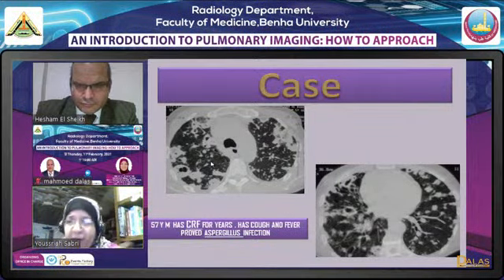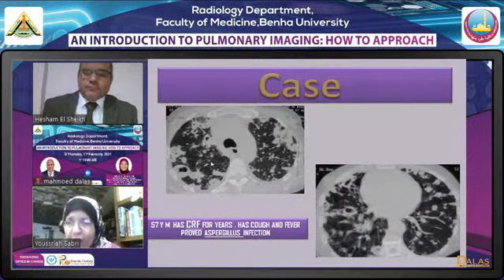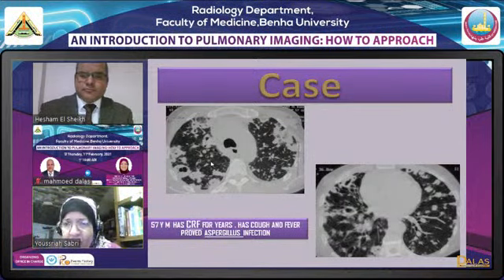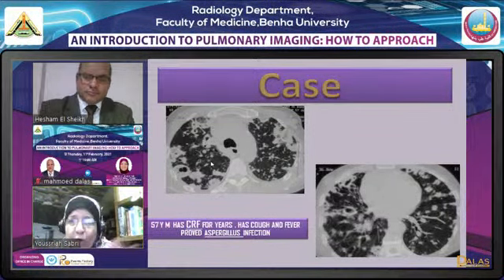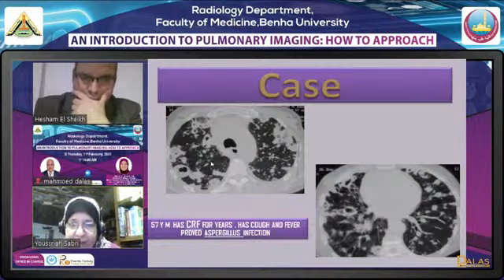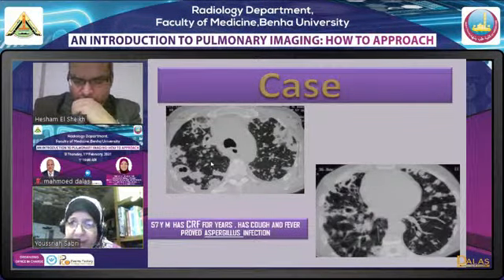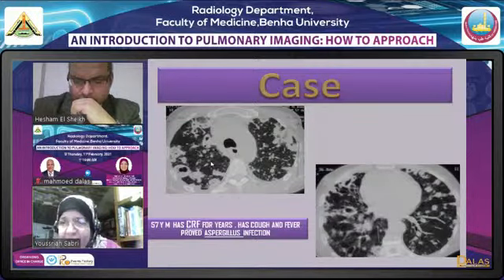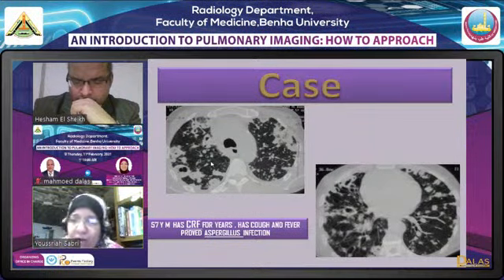اتيبيكال انفكشن. اتيبيكال انفكشن ده افكر في ايه بقى؟ والله العيان غالبا بيبقى اميونو كومبرومايز باي واي اور انذر، بياخد كورتيزون، عنده سكر جامد مش كنترول، العيان لسبب او لاخر عامل ترانسبلانتيشن وات ايفر، رينال فيلير، كل الحاجات دي هتخليني اكونسيدر ان ده اتيبيكال. يعني ايه اتيبيكال؟ يعني كوزد باورجانيزم مش العادي اللي بنتعامل معاه، مش نيمو والكلام ده، بنتعامل مع فانجس، بنتعامل مع فيرال، وات ايفر، كل ده كونسيدرد اتيبيكال.